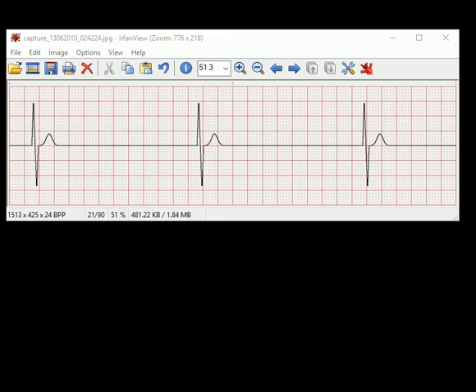And if you look at the large lines, so if I were to trace a box like this, here I'm going to kind of do it a little off-centered here so that it works. If that was essentially a 5 by 5 block, that's going to be one large block. And a large block is 5 small blocks. So if I do the math on that, half of 5 is 2.5. Well, 3 is more than a half of a large block wide.